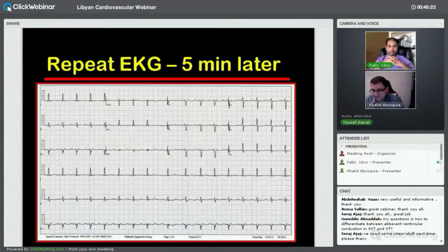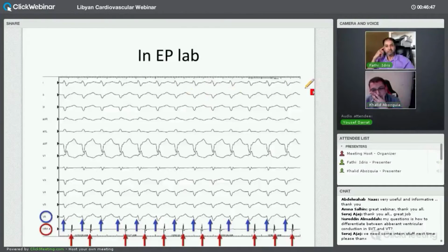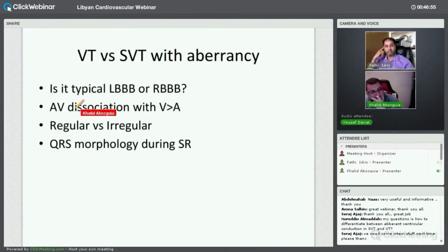I think Brugada criteria is useful. Using the stepwise approach, I think it helps to understand why this is VT versus could be an SVT or aberrancy. Now, the accuracy, sensitivity and specificity is not 100%, but it's close to 98, 95%. So you can make a diagnosis using Brugada criteria. As I mentioned, if you're experienced, you can look at an EKG in a few seconds and make up your mind. But for the beginner, going through the algorithm and protocol would be very helpful.